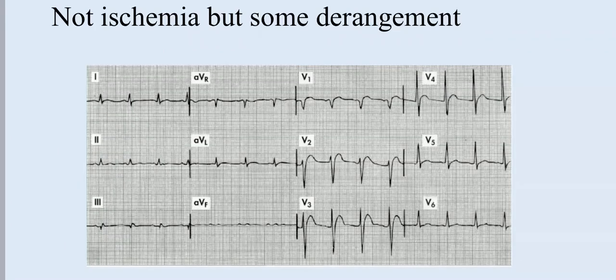What is that? I have an impression of ST segment elevation, right? Do you have that impression, Adam? I have a question if you don't mind. Oh, yeah, sure. Digoxin toxicity and digoxin effect from the ECG.